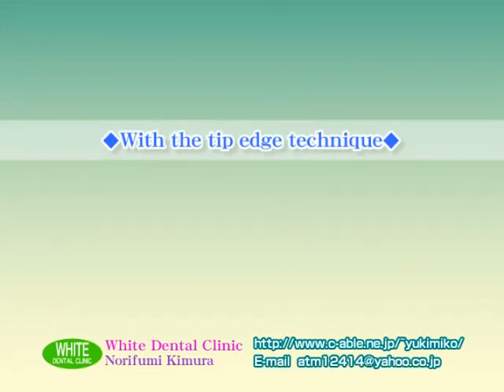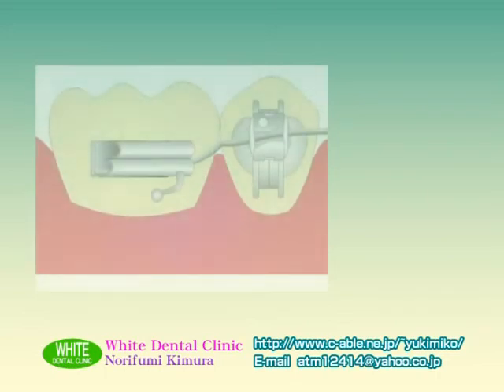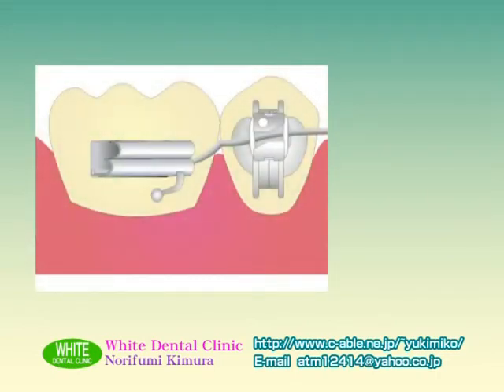With the tip edge technique, uprighting of the premolar is achieved after closing the space with tipping movement. Since occlusal adjustment before uprighting may cause subtle changes in occlusion afterwards, occlusal adjustment should be performed simultaneously or after uprighting. The speed of intrusion or extrusion seems to be slower than that of the edgewise technique due to the use of a sidewinder spring or a nitinol wire in the tip edge plus.